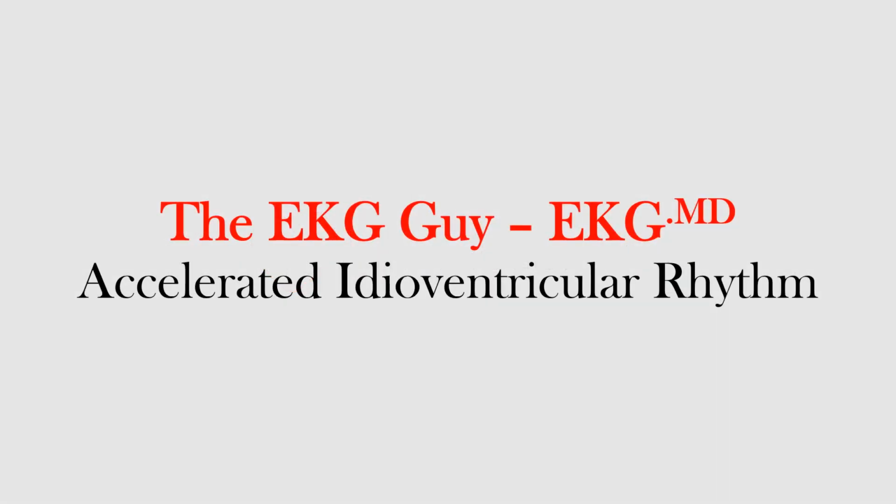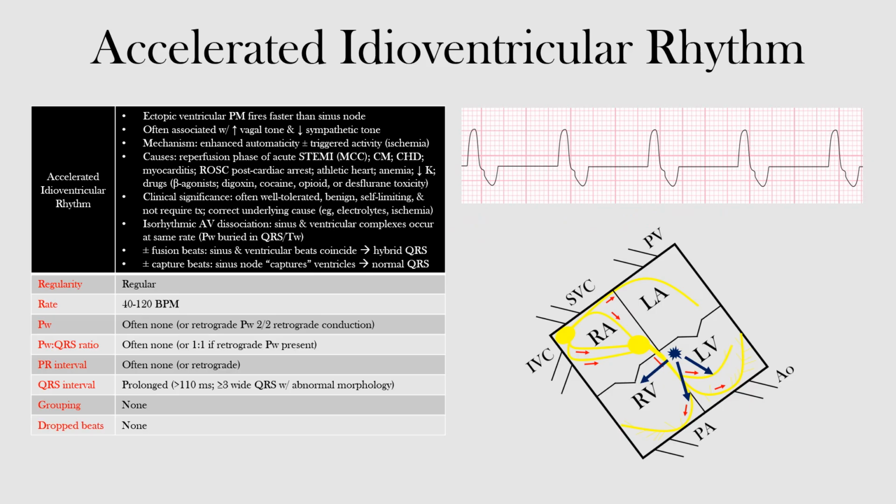In this lecture, we will discuss accelerated idioventricular rhythm, including its origin, mechanism, potential causes, clinical significance, and EKG features. Accelerated idioventricular rhythm is simply a fast ventricular escape rhythm. In adult patients, the rhythm is defined as a ventricular rhythm that is faster than sinus rhythm, but just below the threshold of what we would consider ventricular tachycardia.